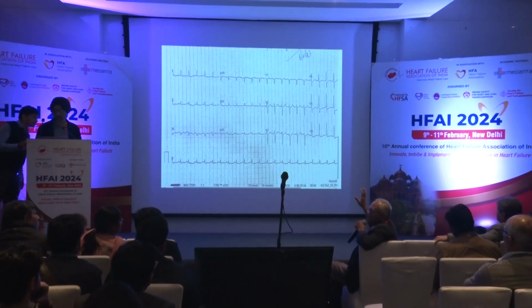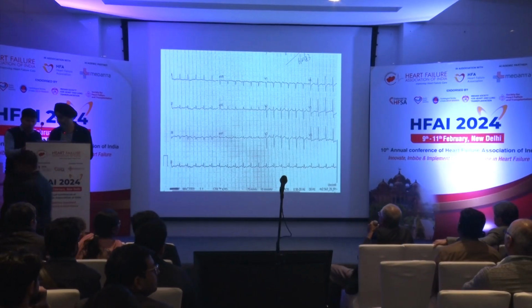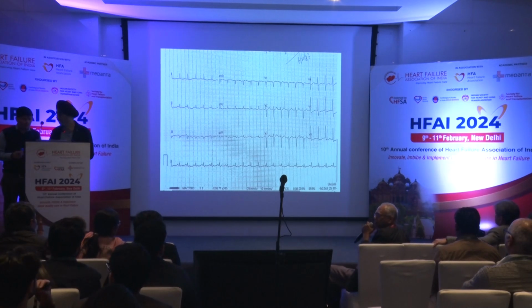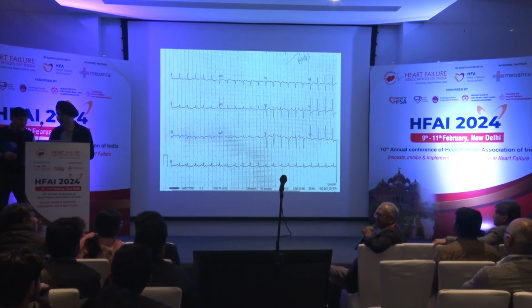So this is clearly an atrial tachycardia. This is not a sinus tachycardia. And in such cases, when there is a 2-to-1 conduction, how will the patient generally present?